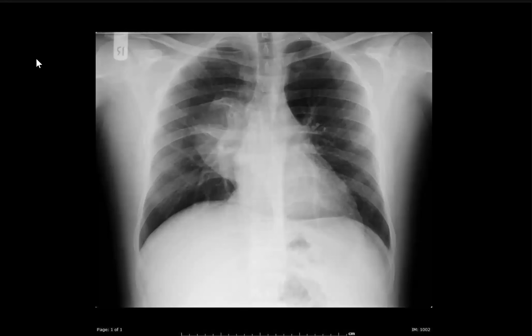Okay, sir. A 30-year-old patient with shortness of breath. I am provided with a chest X-ray, frontal projection, of a skeletally mature patient. I can see an opacity along the right hemithorax, well defined laterally and ill defined medially, so it is likely of mediastinal origin. I can see the hilar vessels through it, so the hilum overlay sign is positive.